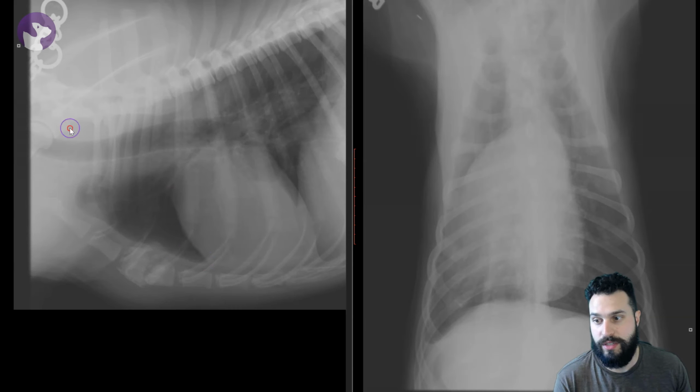However, we still lose a little bit of this along the margins of the cardiac silhouette where we're not fully getting it. So that's something important to note, and really be judging our radiographs to be sure that they are appropriately exposed, that we're able to see the pulmonary markings out peripherally as well.